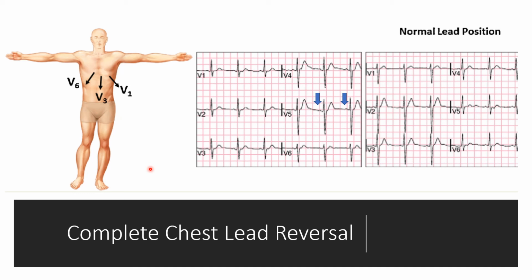Well, one option is switching of the right arm lead to left arm lead, and also switching the precordial leads, where the precordial leads are completely switched in the reverse direction, with V1 being attached most laterally and V6 being attached most anteriorly to the right of the sternum. So the EKG waveforms will look exactly opposite to what is normal.